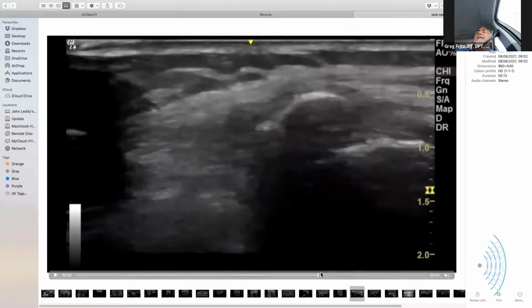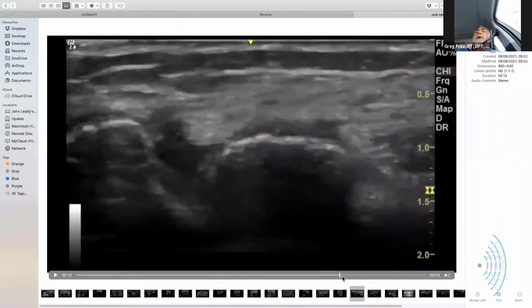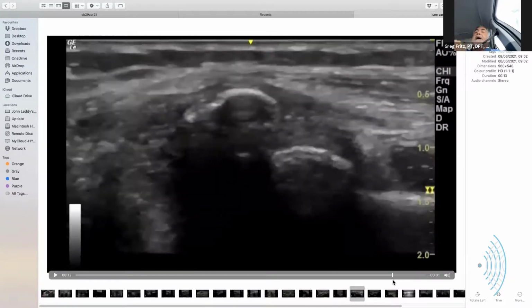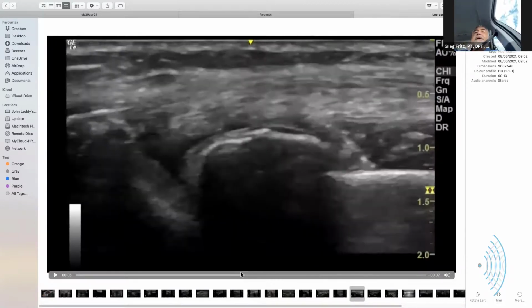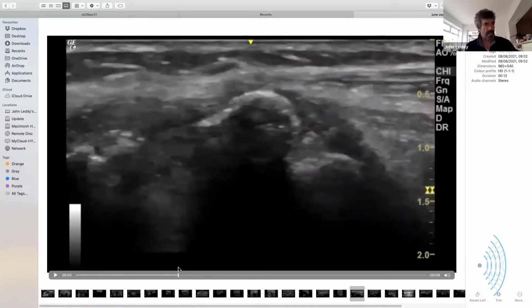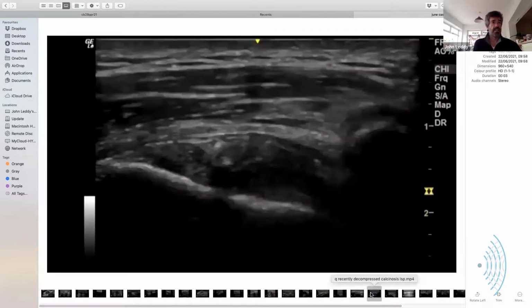I've had that exact thing happen where there's been material like that right over the radiocapitellar joint, and I couldn't figure out whether it came from a compression fracture of the capitellum or whether it pulled off the lateral epicondyle. Interesting. Yeah, that was my best guess because the fibers ran very strongly into it, and I haven't shown it here well, but I couldn't really find a nice view.